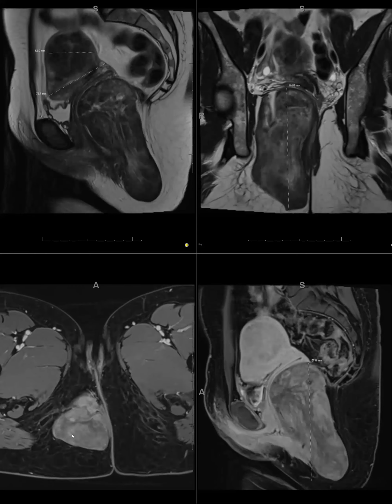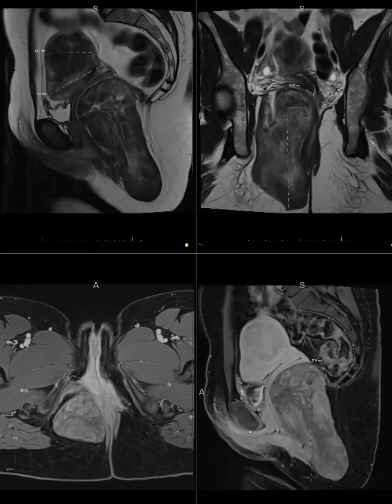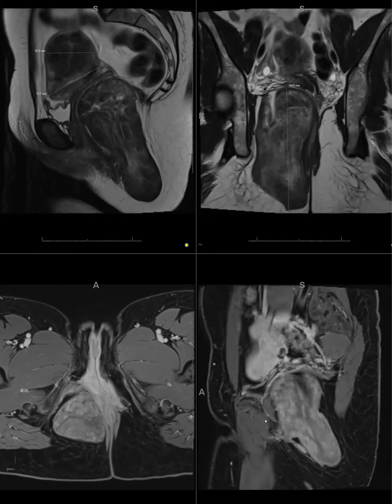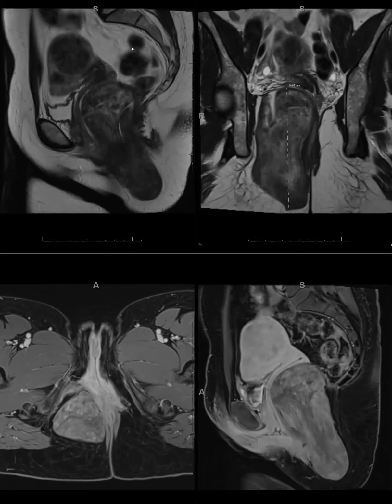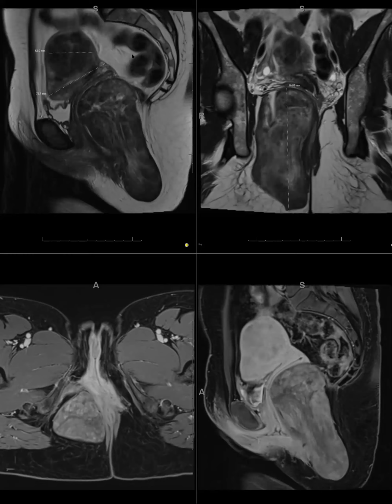And we have seen over the years in case reports and such, leiomyomas at any sort of place, even as a solitary thing, usually around the female pelvis. And then as you get further away from the pelvis, fewer of them. She happens to have some additional fibroids in the uterus, maybe with similar appearance even, but I think when I've read about this, there's something about the hormonal milieu of a female pelvis that's able to initiate and or support leiomyomas forming in and around the uterus and adnexa. But I've not seen one below the pelvic floor before.